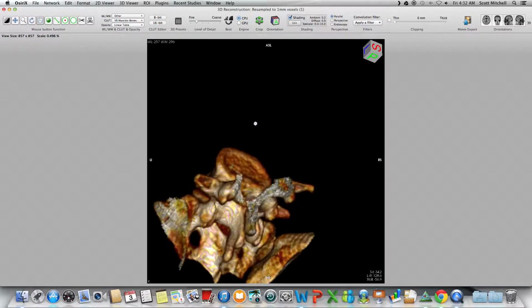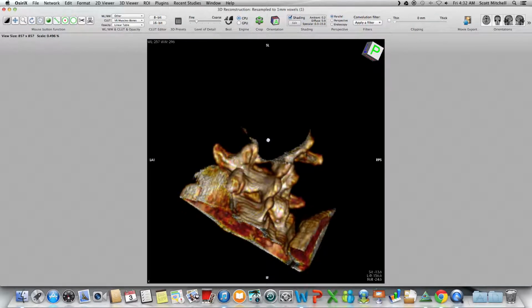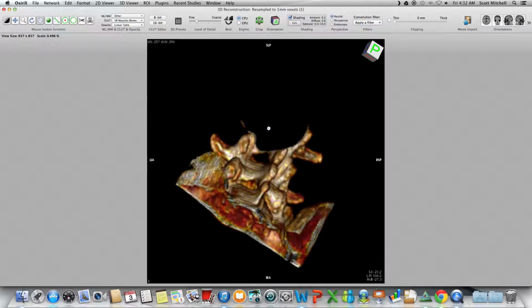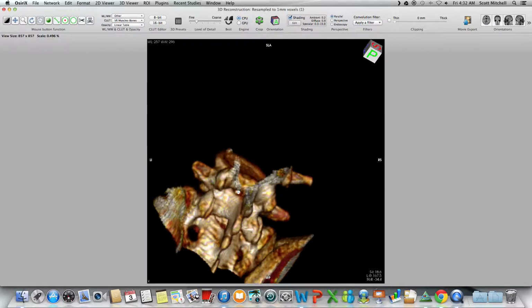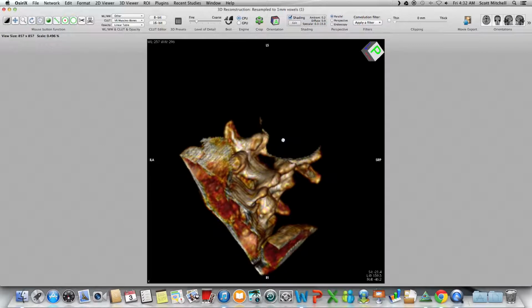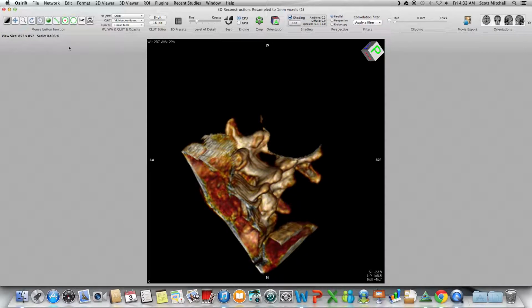We're looking pretty good so far. Okay, so I'm going to try and cut this as anatomically correct as possible. And you're not going to be able to get 100% accuracy just based off of how this is. And that's okay. These are CT scans. They're not 100% accurate representations, but we're going to do some stuff in the post-processing to make everything look a little bit smoother.